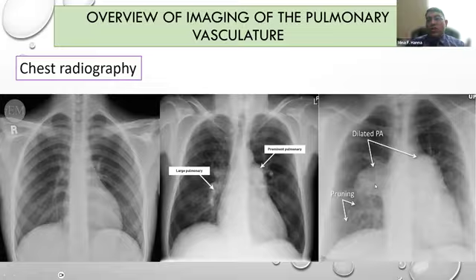This is hugely dilated. We used to see something like this in cases with bilharziasis. In very advanced cases, we even see something like an elephant trunk. It looks like an elephant head with the pulmonary artery coming out of it. So the very huge dilated pulmonary artery can be seen in the extreme cases of pulmonary arterial hypertension.